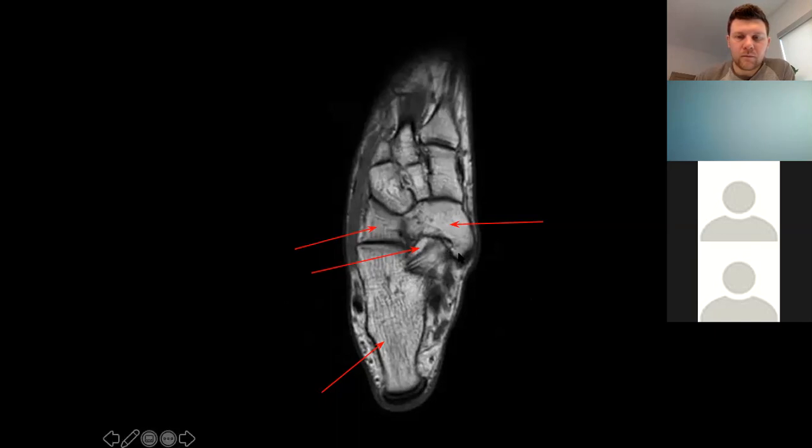Is that the talus, like the bottom? Yeah, see right here the navicular, this has got to be the talar head. You're visualizing a little bit of the talar head, and then getting the spring ligament right below it. So that's a good supporting image there. Okay. And then what bones do we have out here?